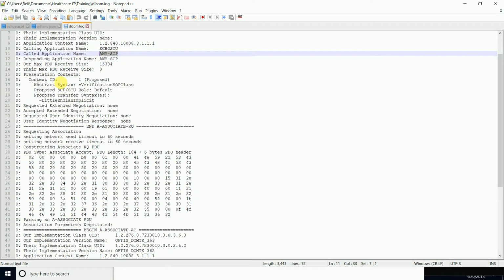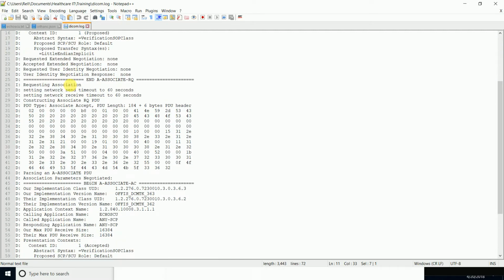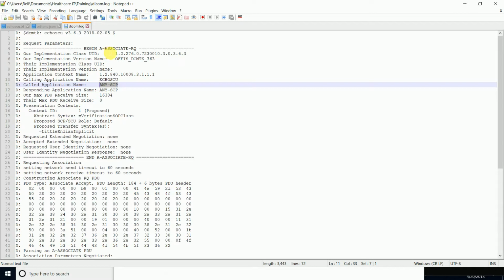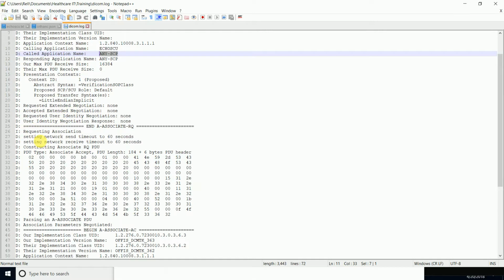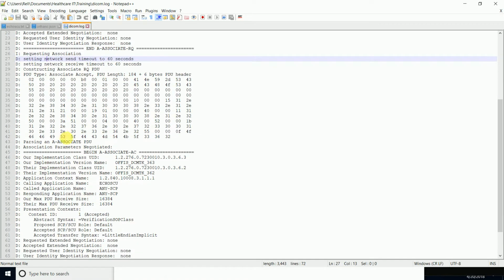And then we have some other items here. We'll come back over. So for the association request, requesting association. Association parameters negotiated.